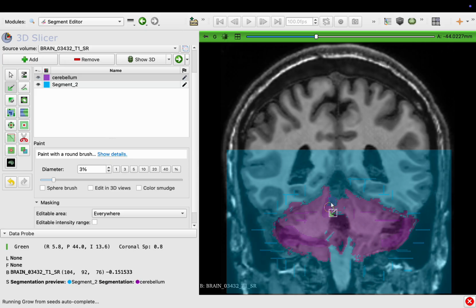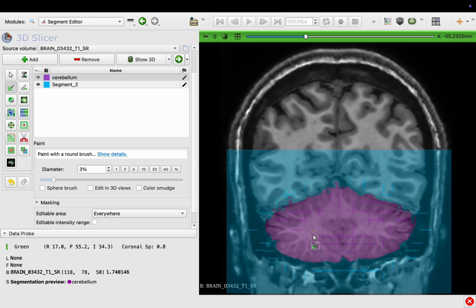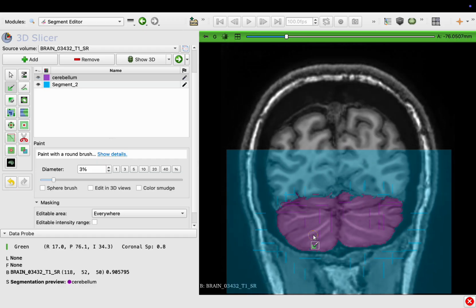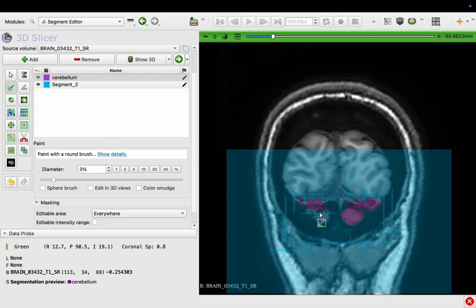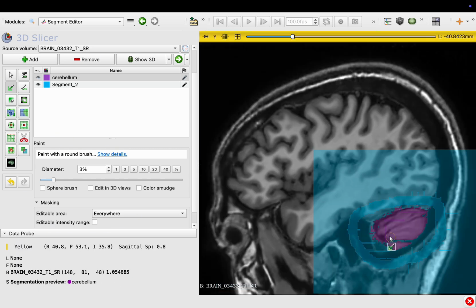You just need to correct big mistakes in this step. And we have other tools and other methods to correct small mistakes that I am going to tell you. In this stage, you just need to correct big mistakes, big leakages, or big under-segmentations.